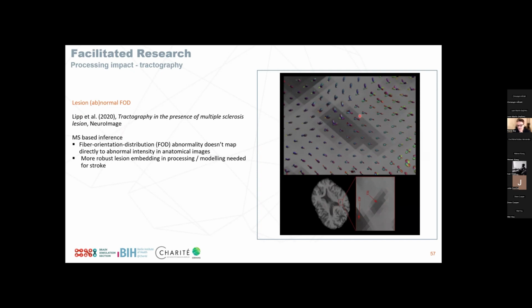What this means is, if we zoom in and look at the data, they look at the actual distribution that we mentioned before, like how probable it is for tracks to go along one direction in these voxels. We see that especially here at the outline of the lesions, at these slightly darker intensity values that are still part of our lesion mask, if we would draw it based on the T1 image, the voxels are actually identical to neighboring voxels. But we do still include them as pathological tissue and say all of this here is not, we don't want to track those.